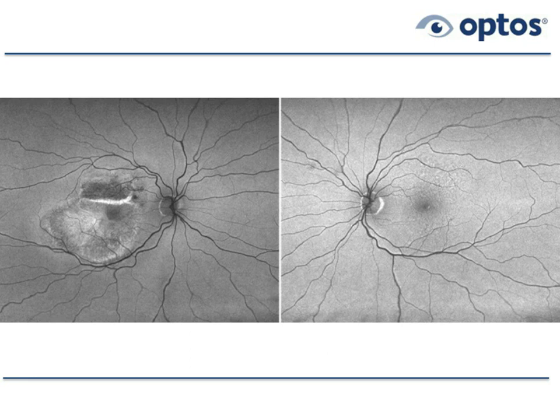And the patient had hemorrhaging and a fibroglial scar, and there's this bright horizontal band that you see going across on the autofluorescent image in the right eye, which is on your left, and that actually corresponds to a retinal pigment epithelial rip, where the RPE actually rips and coils up on itself. And with the coiling of the retinal pigment epithelium, you're looking at more than one cell layer thick, which typically has this hyper-autofluorescent pattern. So if you ever see this, this is very typical of a patient that has wet AMD and had a retinal pigment epithelial rip with the tissue wrapped up on itself.